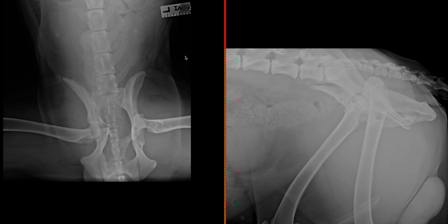In this case of trauma, we've identified peritoneal and retroperitoneal effusion with loss of the boundaries of the lower urinary tract, heightening our suspicion for rupture. This can be characterized further with a positive contrast cystourethrogram. We also have identified pelvic polytrauma evidenced by the disruption of the right load-bearing axis, the ileal body and acetabular fractures, and the left load-bearing axis, the left coxal luxation. This can account for the patient's inability to rise.